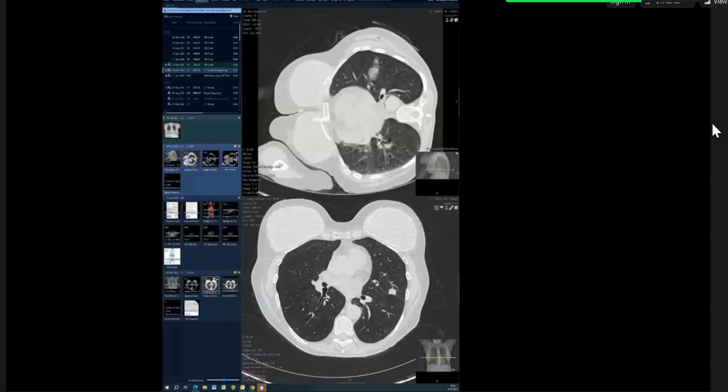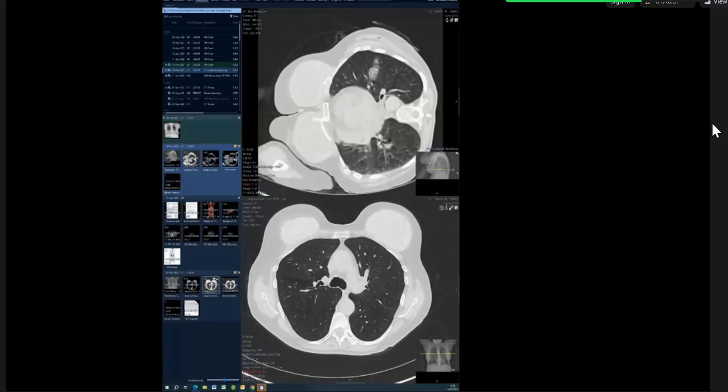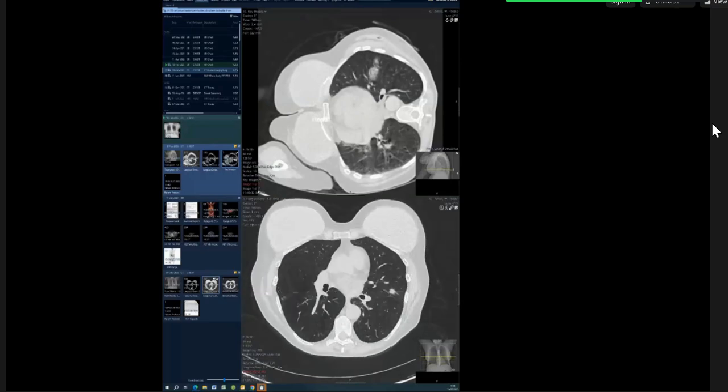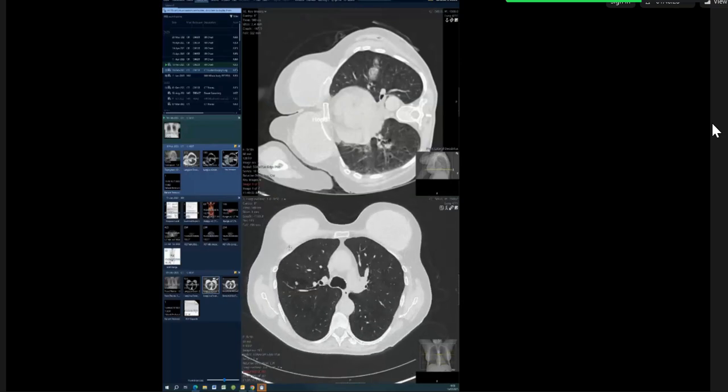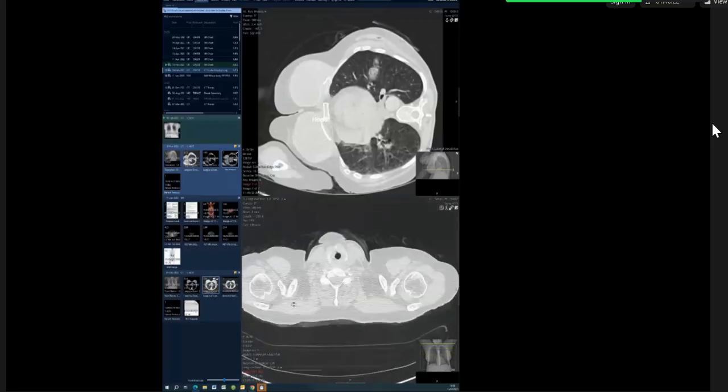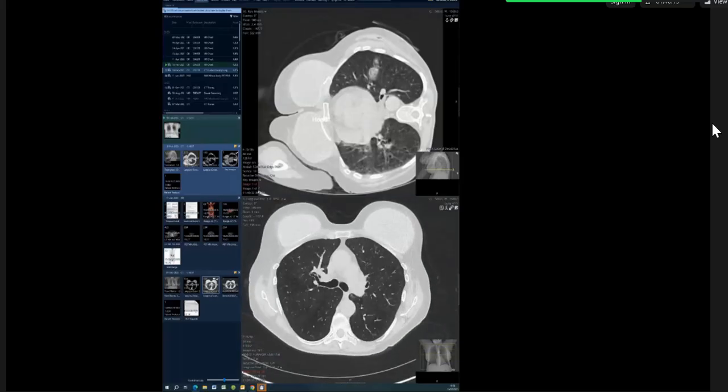So you're suspecting a lung primary, yeah? You haven't said that word so far, primary lung malignancy. If it wasn't a lung primary, your first thought was metastatic from extrathoracic malignancy because they're bilateral. If there's no known primary, you're suspecting a lung primary. Either they're both primaries or one of them is a primary and the other is the met, or it's a melanoma or something weird and wonderful. So, like I said, we'll come back to it at the end. I will give you a third one. I think we can squeeze in one more.